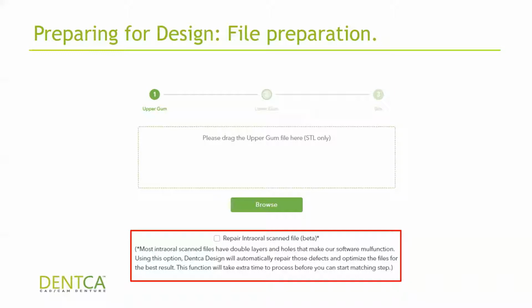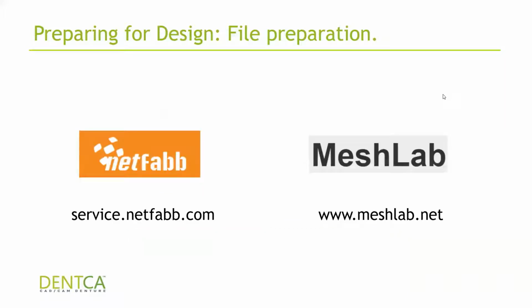And I'm going to talk a little bit more about the process later. But on the screen at the bottom, you'll see a section that says repair intraoral scan file. Make sure you check that box. It usually appears when you're about to upload the upper gum files. And if you check that, as soon as all the files are uploaded, the software will clean these out for you.